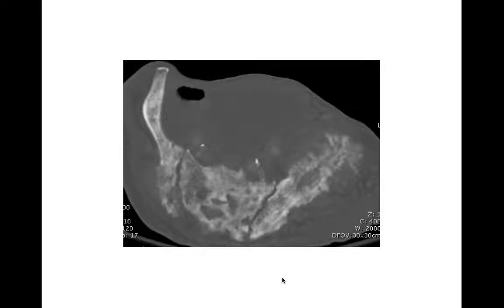All right, this one clearly looks scary. CT scan shows this hair-on-end periosteal reaction along the iliac bone, and there's this diffusely infiltrating sclerotic lesion throughout the sacrum and the left iliac wing, and partly into the right iliac wing, and there's a soft tissue component associated with this. So again, an example of a very aggressive appearing periosteal reaction. When you think of differentials, I don't think any benign things are really going to be on your list. In this case, it was a malignant degeneration from Paget's disease.